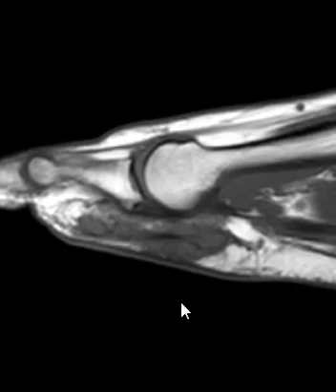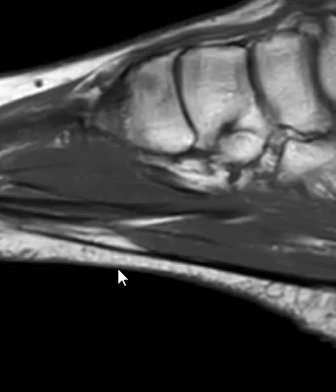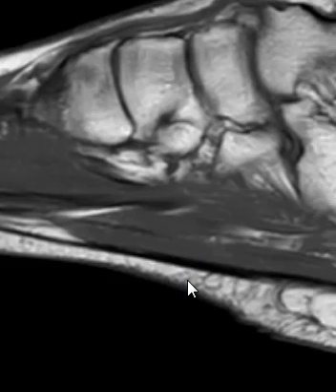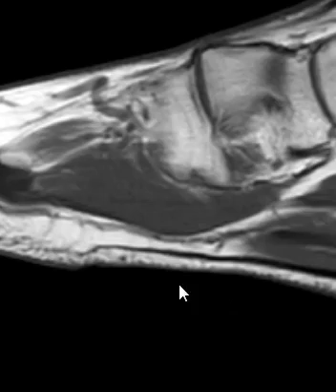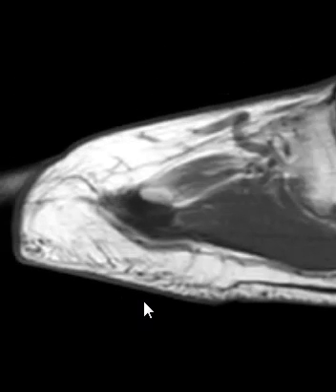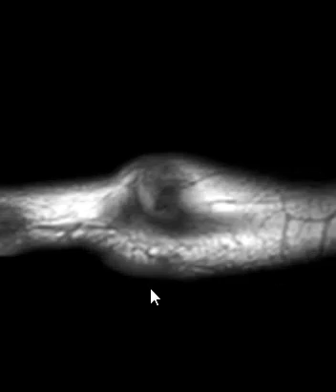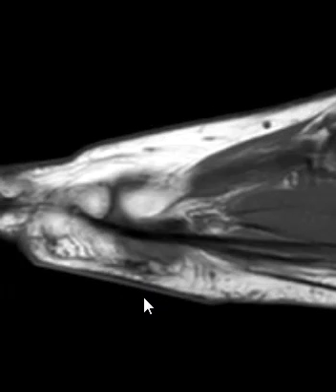There is something we see commonly called a plantar fibroma, and that's in the plantar fascia back here. The plantar fascia should be nice and dark and smooth, and if we see a localized, well-defined area of intermediate signal, we call that a plantar fibroma. This patient has a beautiful plantar fascia, but more distally, involving the plantar soft tissues and some of the fascia, they had this more irregular, ill-defined, infiltrative process, and this is plantar fibromatosis.